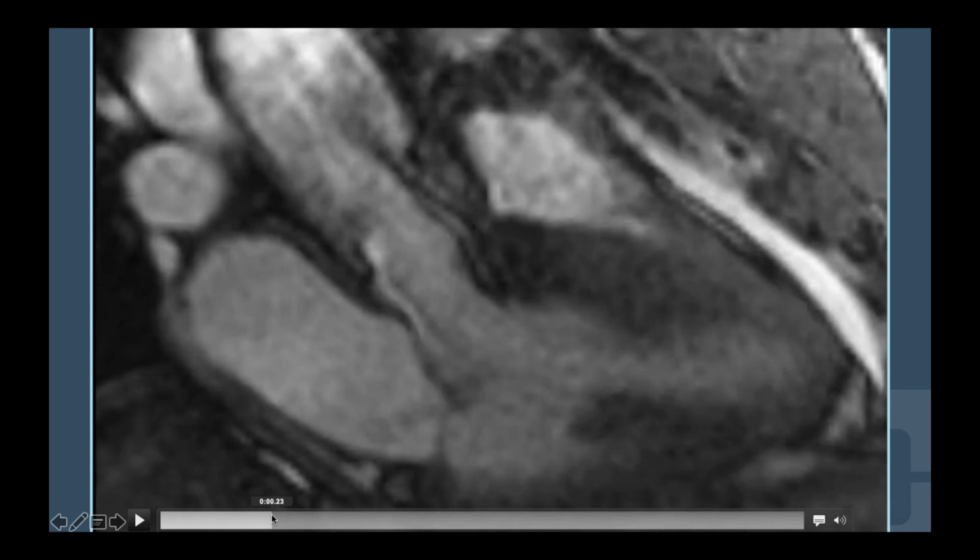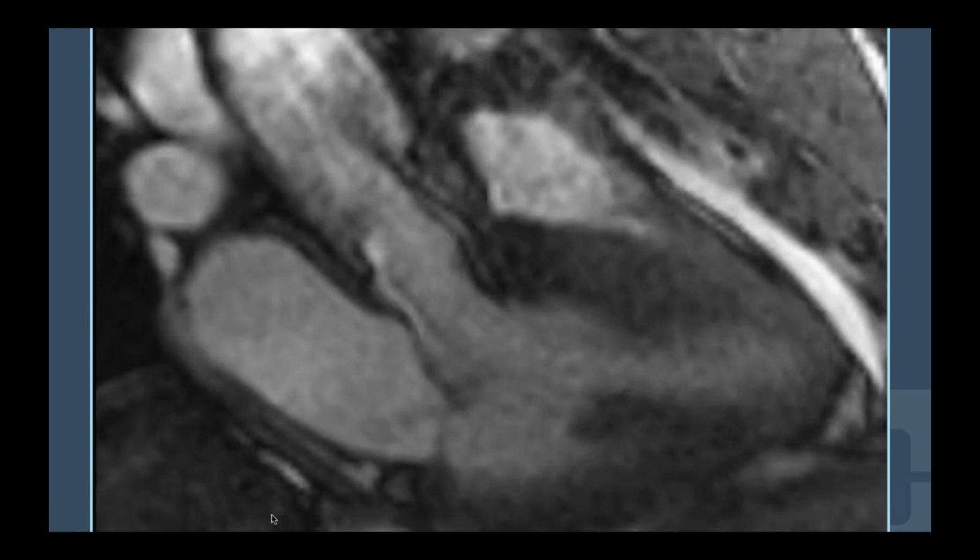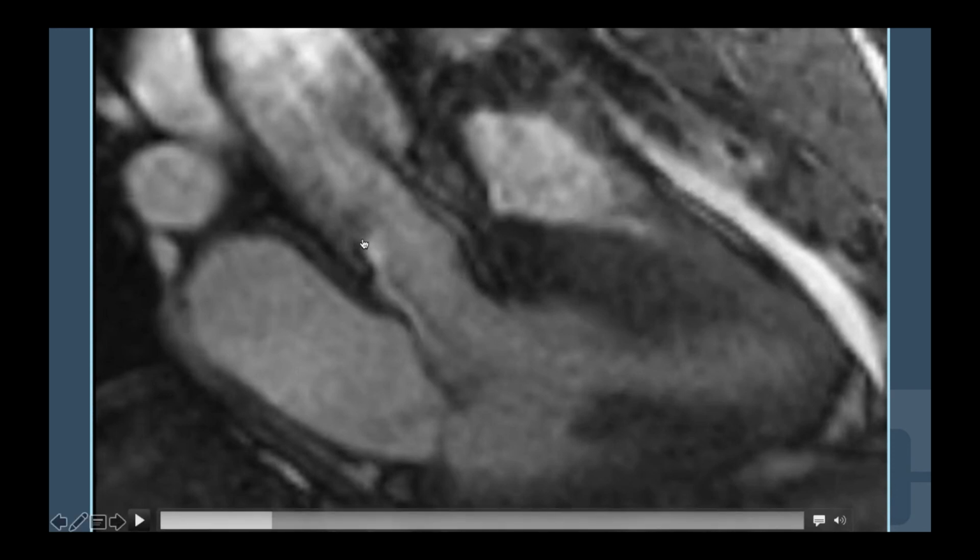This was initially mentioned on echo, and it was part of why the exam was done. I'm taking here a stair-step artifact of the aortic valve leaflet. When they came in for the aortotomy approach, the scalpel coming down and through the valve orifice, they damaged the valve, they cut through it, so they had to go in and sew it back together.